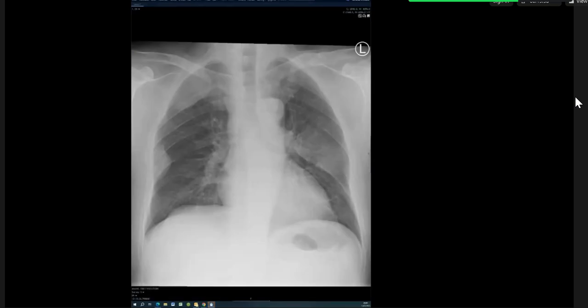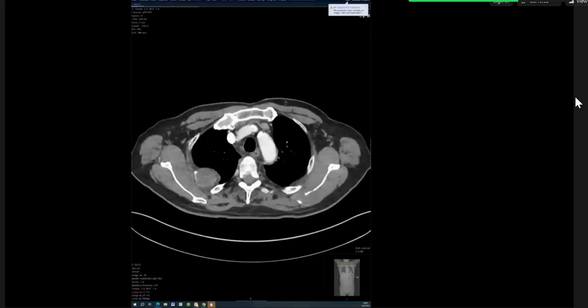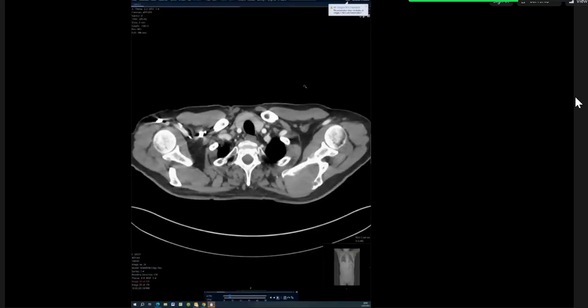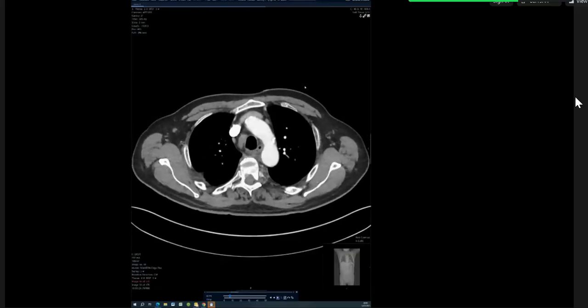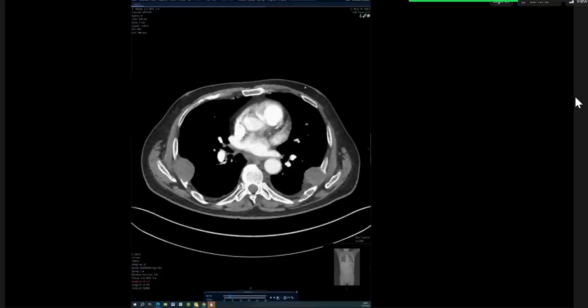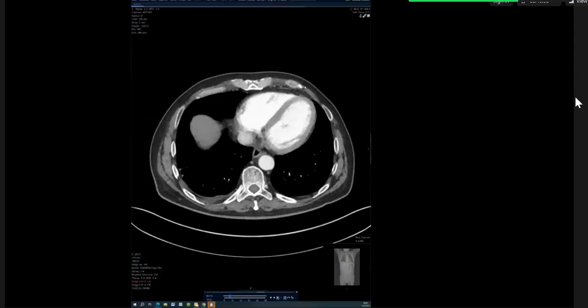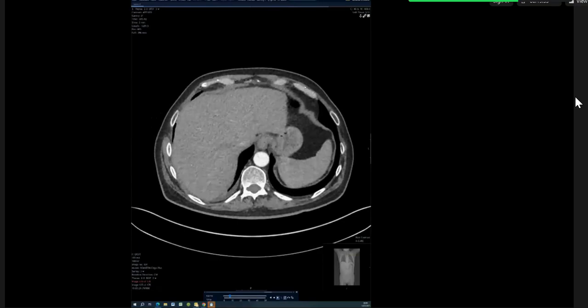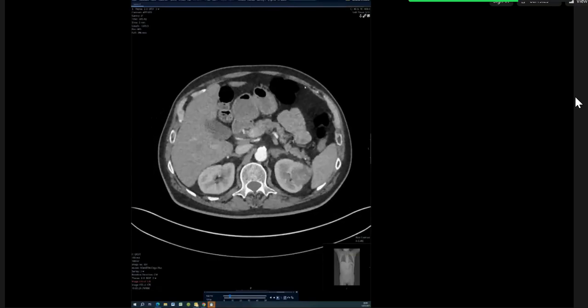Less likely. Primary bone. It can also be metastatic, apologies. So they're bilateral. So at least one would be, if they were primary, you're saying one primary bone tumor that was metastasizing to different ribs? Possibly, or it could be a malignancy elsewhere that has metastasized to the ribs. And actually, I'm just trying to see if there's any other abnormality that I can spot.